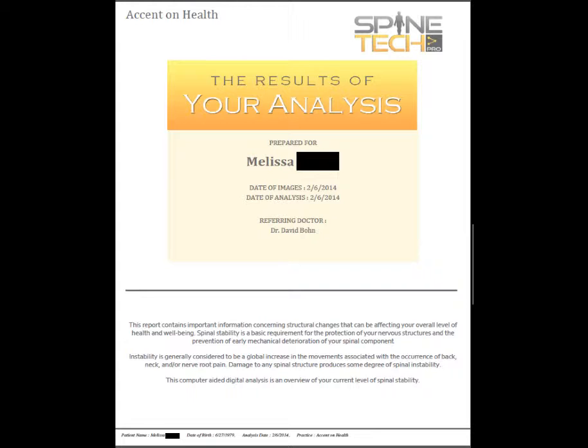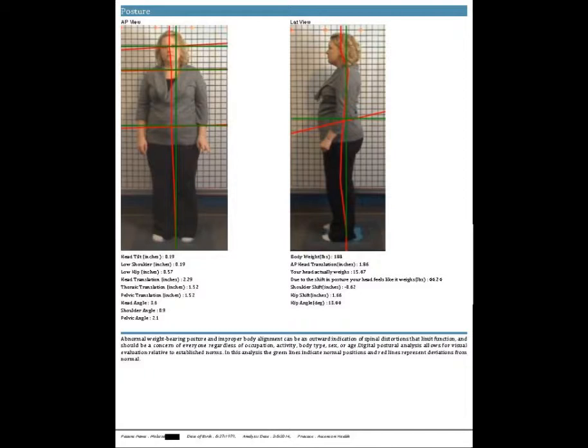The first thing that I like to talk about with my patients is posture. So you get a complete posture analysis here that you can capture right from your software. Digital camera hooked through the USB port, you'll be good to go. You can use these backdrops. You'll see that there's these boxes. Each box represents 2 inches. Every 6 inches there is a little red orange mark. So from here to here is 12 inches, and that's what calibrates the software.